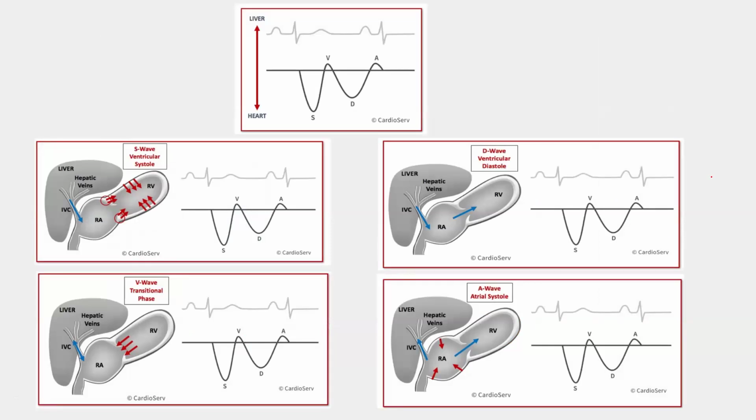This is the hepatic venous Doppler. Okay guys, assure me that you are still following, because this is the last part. This is the last part.